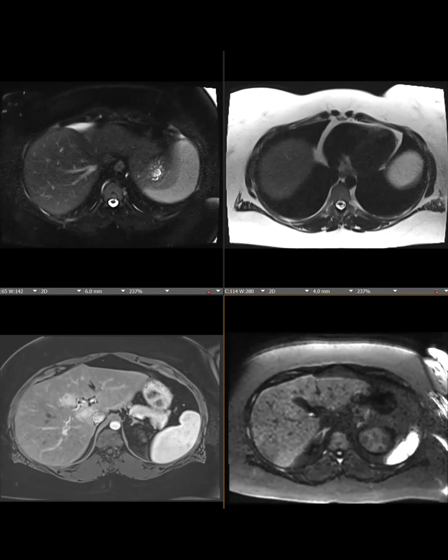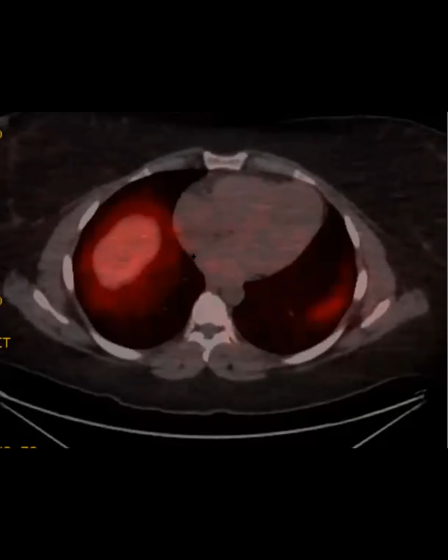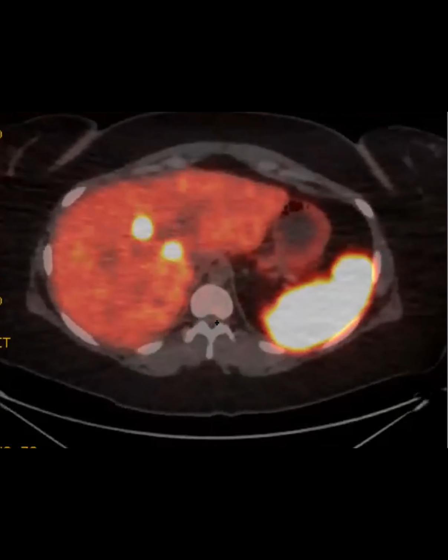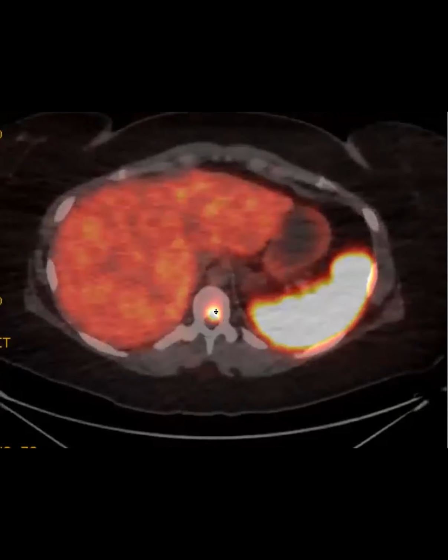So let me just show you a follow-up study. And again, I want to just shrink this box and make sure I do this correctly here. Well, I'll just show you and then maybe we can talk about it. So basically, this is a dotatate PET, which pretty much gives it away.